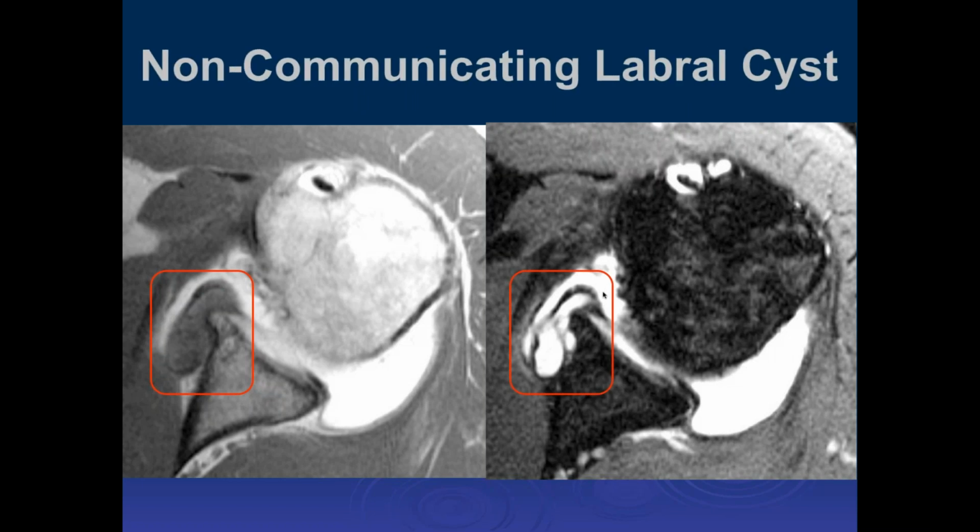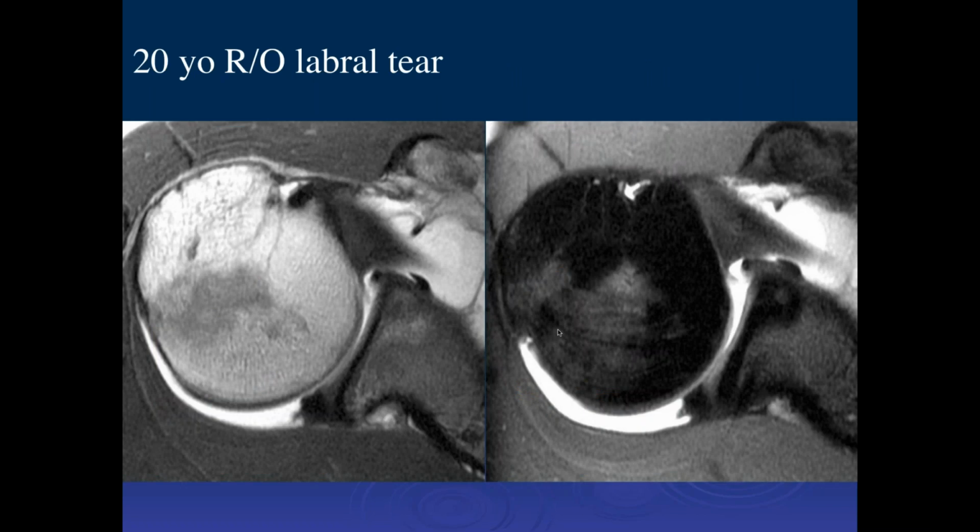So this is just a labral tear and a large paralabral cyst. And this just points out that quite commonly the paralabral cysts will not fill with contrast. They're generally filled with a gelatinous type structure. It's generally not fluid, even though it looks like fluid, but it's gelatinous, and I don't think the contrast can diffuse into it very readily. If you bring these patients back and scan them a day later, you'll find that you'll get some enhancement of the gelatinous material because it eventually will diffuse into the paralabral cyst. But commonly, if you do arthrograms, you will not fill the paralabral cyst. Just be aware of that.